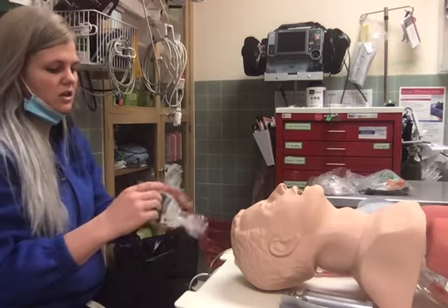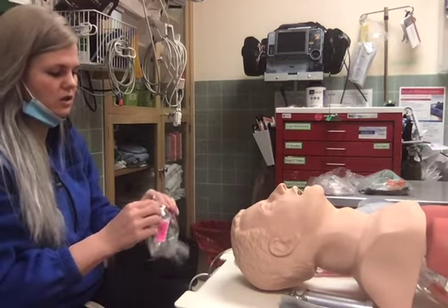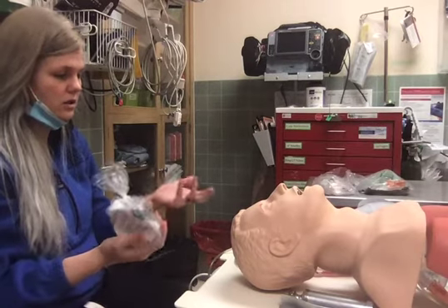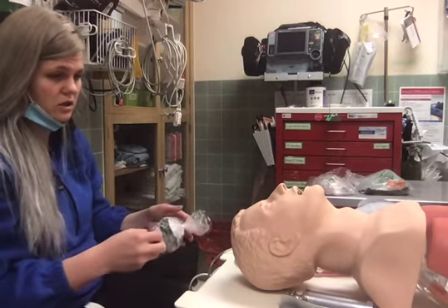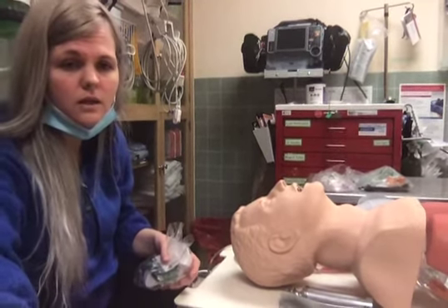A contraindication to this is just a failing ability to utilize that oxygen. Indication is just like the nasal cannula, just needing an increase in FiO2 in your environment.